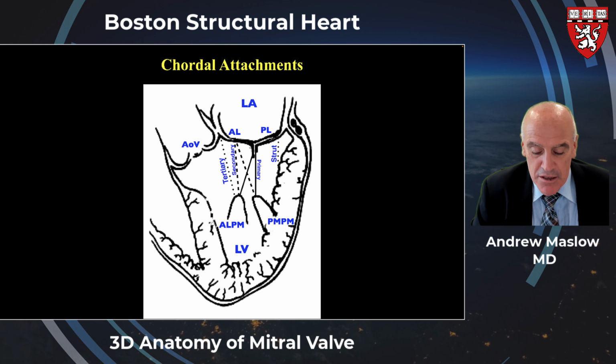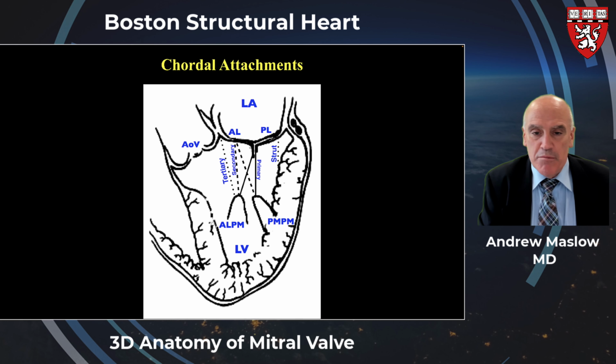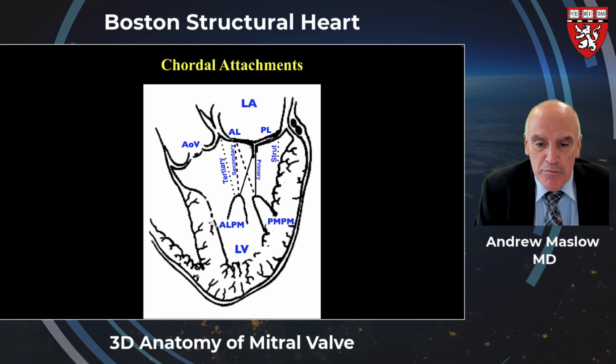Together, they prevent excessive motion of the mitral leaflets and also help maintain the shape of the ventricle. Thereby, repairing the valve is always favorable with regard to outcome, both for mitral outcome and for ventricular function and patient functional status.